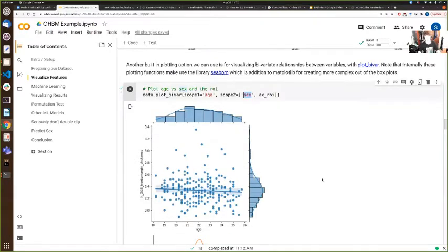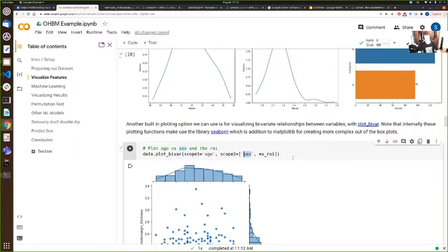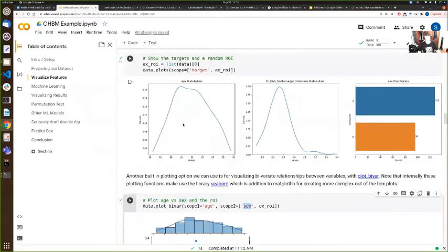It's usually a good idea to just go through and look at some simple, what's called exploratory data visualization. The idea is basically you want to catch these small errors that might sneak in. Maybe we look at the age and the plot instead goes out to 35,000 just because there's one random outlier. Someone's age added 2 zeros or something. That's the kind of thing you're looking for. Some other things you might look for are highly skewed variables, which you might want to apply some transformation to. But in this case, these thickness ROIs are pretty uniform.